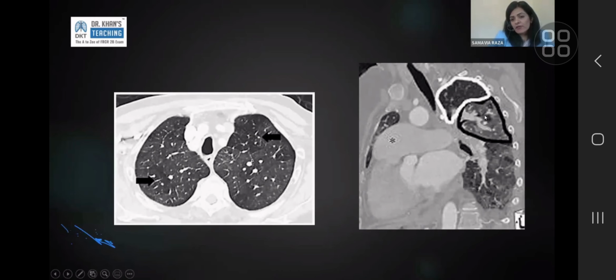On visual inspection, you can say, oh, is this mosaic attenuation? Well, it is, but does it really imply a diagnosis? Is it helpful in any way? Not really. So would you be right in describing that lung, that axial section, as mosaic attenuation? Yes, you would be.